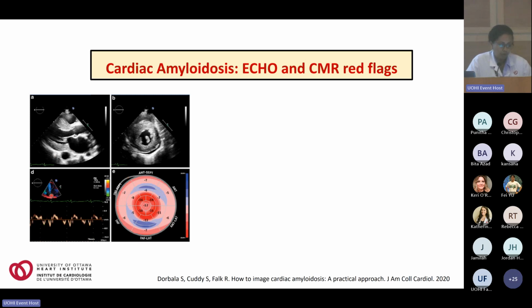They may have a significant diastolic dysfunction, and on the global longitudinal strain, the pattern of the base and mid being more affected with apical sparing can be helpful, but this is also not a very specific sign as it may sometimes be seen in patients with CKD and aortic stenosis.